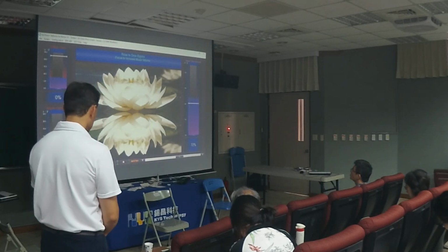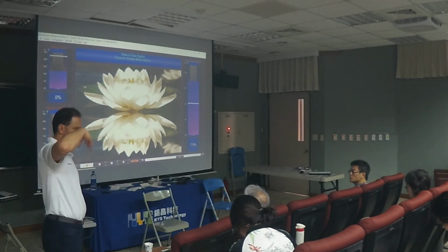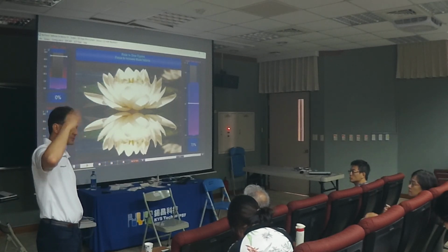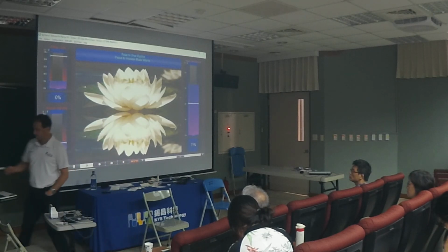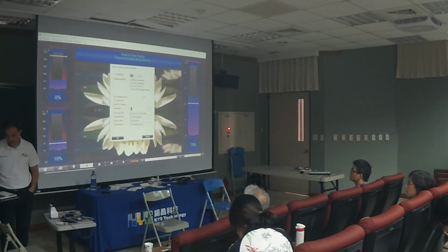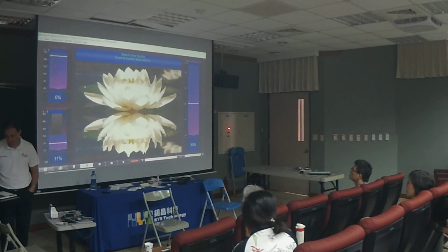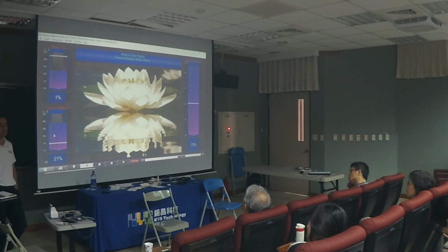Now, sometimes you're going to have a client with a lot of activity. So the bar is going to be going up and down too quickly. What you can do for that is you can right click, go to display options and ranges, and you can smooth it out. So if you smooth it all the way, see how the bar changes? It's not jumping too much. So you can do some smoothing as well. And again, play with that.